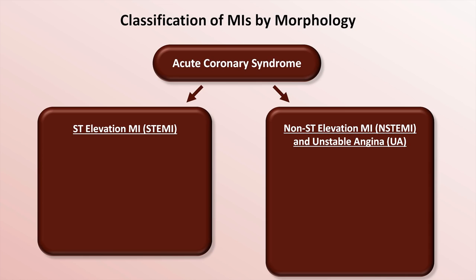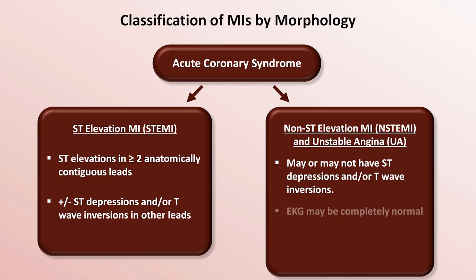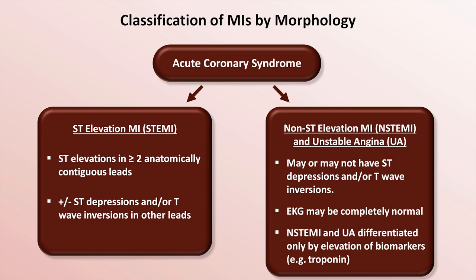Electrocardiographically, STEMIs demonstrate ST elevations in two or more anatomically contiguous leads, and usually, but not always, ST depressions and/or T-wave inversions in other leads. NSTEMIs and unstable angina may or may not have ST depressions and/or T-wave inversions, but the EKG may also be completely normal.